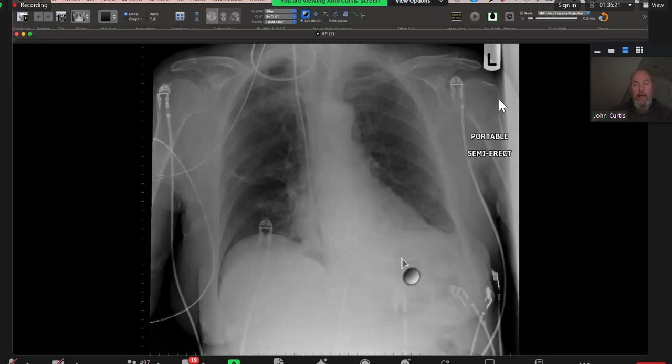Right. So now, once they've had the pacemaker put in, that corrects the complete heart block, which is causing heart failure. So the patient now goes back into some sort of paced sinus rhythm, but they're also complaining of chest pain. Why? Sir, I'm looking for pneumothorax.